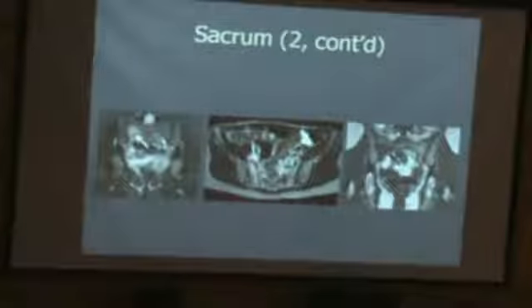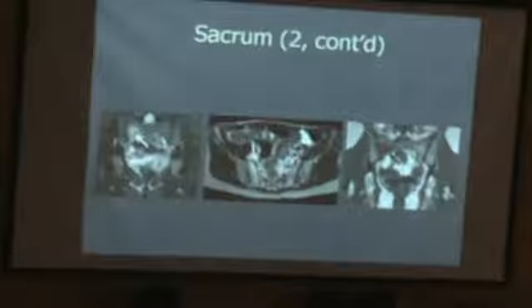You may overlook that fracture, and it happened a few times here. I want to draw your attention to this: the line is parallel to the articulation itself. It's a very thin line, hypointense on T1 and T2. Make sure that you look at it and you see that fracture as demonstrated here.